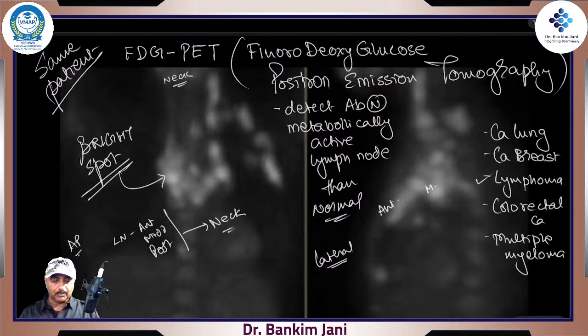So this is how the conditions really look. My intention is that instead of sometimes just cramming, okay, anterior mediastinum thymoma, middle mediastinum this, no, don't cram. Just look at the structure; whichever structure is over there, only that thing can go wrong. That's it.